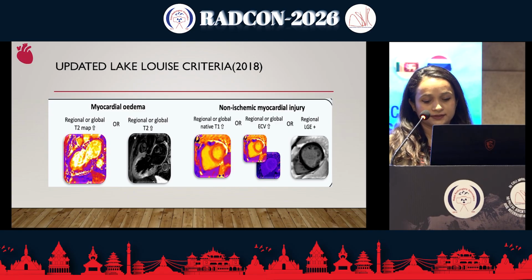Taking myocardial edema as one: if we see an elevation of T2 relaxation time, or regional or global hyperintensity in the wall of the myocardium, that is myocardial edema.